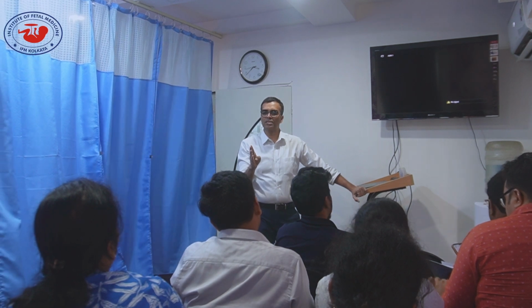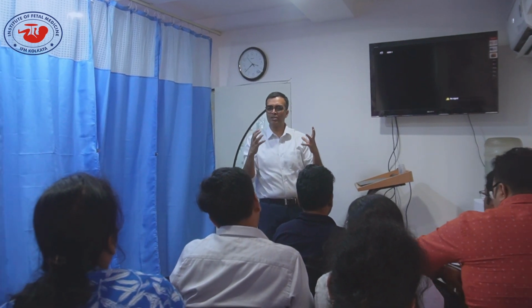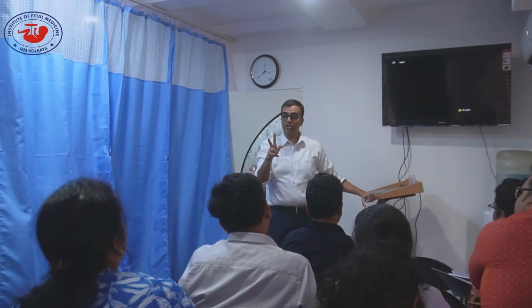So always when we scan postnatally and we see a very weird picture of the renal collecting system, very much dilated and looking very ominous, we always have to ask them to go for a radionuclide scan, because the doctor also knows that prognostication has begun. Now, there are a few radionuclide scan slides I will discuss with you. These are the functional assessment.